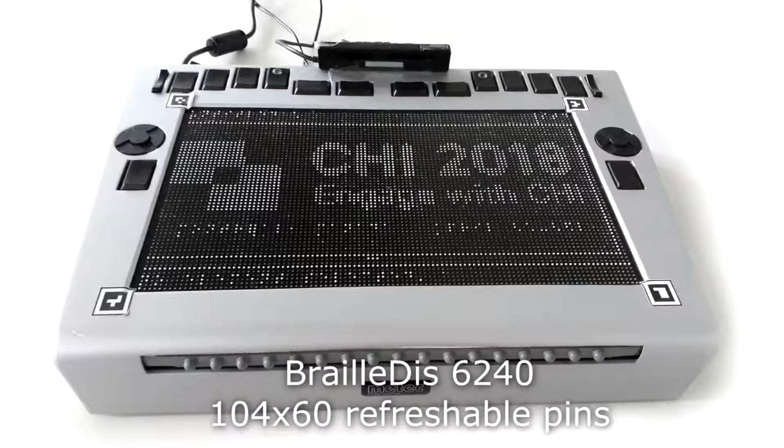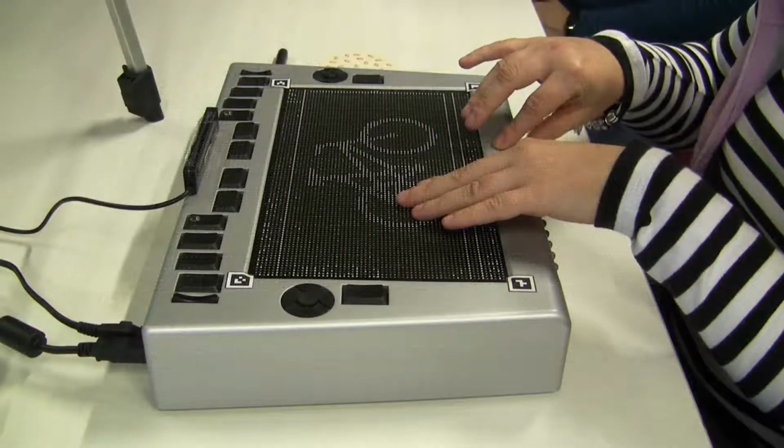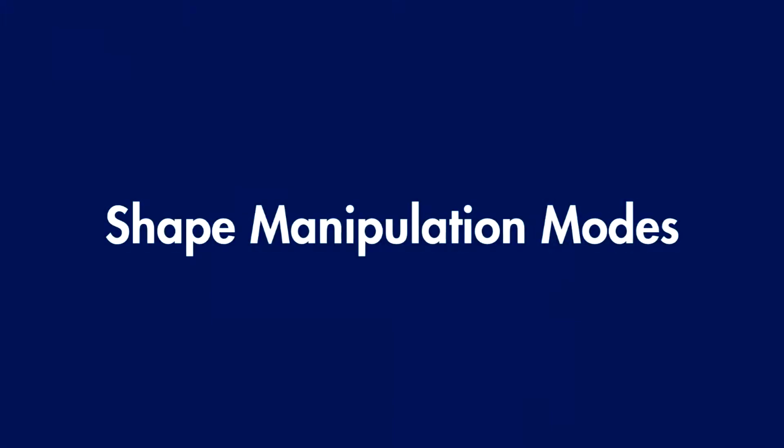The display has a resolution of about 10 dots per inch and is capable of capturing gesture input. Several interaction controls surround the display area. A braille keyboard on the back allows for text and command inputs. Rocker switches enable zooming operations and a navigation bar on the front can be used for panning operations. The user can navigate and manipulate objects using the two 5-key cursor keypads.